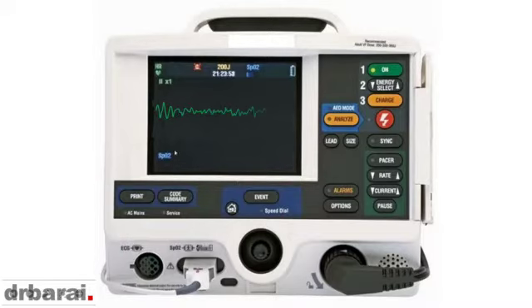As you can see, there is some rhythm here. Let me tell you about this patient. This is a 62-year-old gentleman who presented to the emergency department with chest pain, and obviously, he did not do very well. On the ECG, he has got some ST elevation. We were preparing to take the patient to the cath lab, but he then collapsed. His GCS was 3, no palpable pulse. He was unresponsive. And on the defibrillator monitor, this is what we can find.